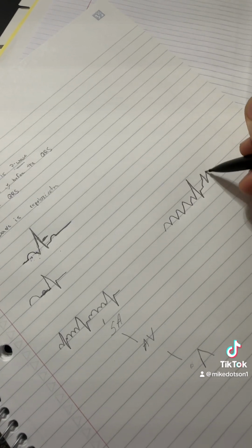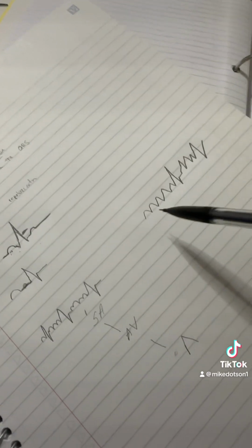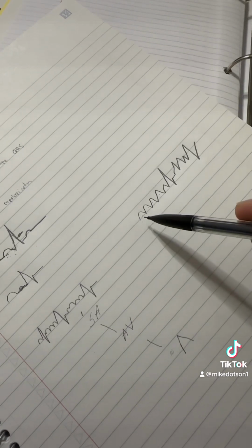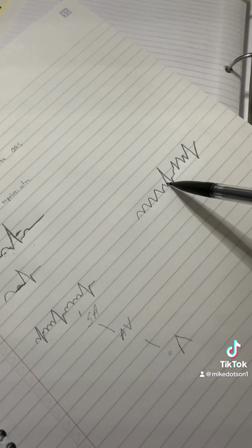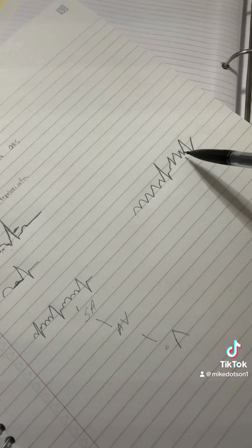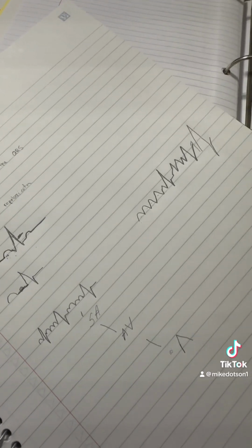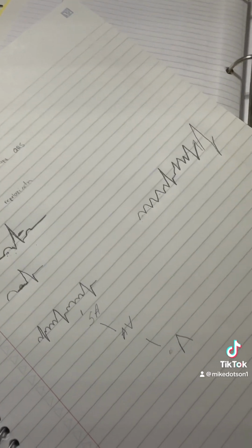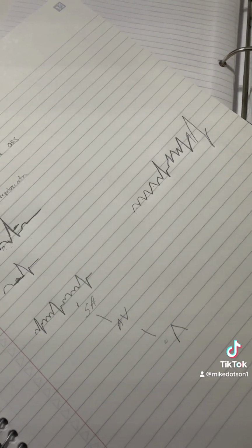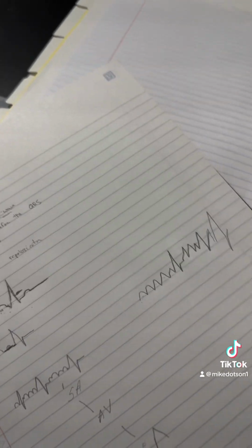Usually these are regular as well, and a lot of times they'll come at a conduction rate of, like this one right here would be 1, 2, 3, 4, 5. 5 to 1. So there's 5 P waves to every 1 QRS. And you would see that continue throughout the trend. You would see 1, 2, 3, 4, 5 P waves, sawtooth P waves, and then a QRS. That's A flutter. Treatment's pretty much the same for that one as well as AFib, depending on if they're symptomatic or not. Like any atrial rhythm, the treatment is usually just Cardizem.